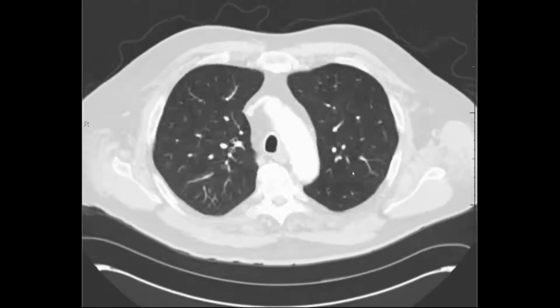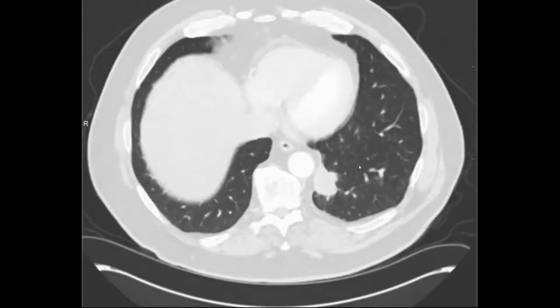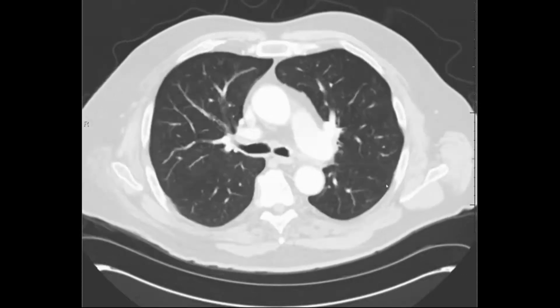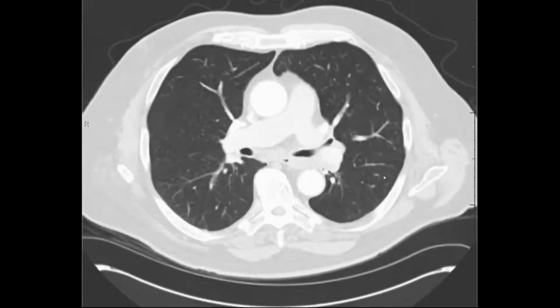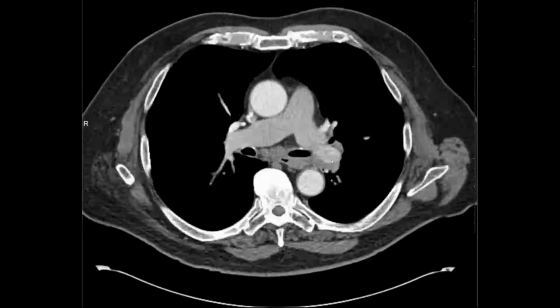And now I would want to evaluate, just because of the size of this thing, I'd be a little bit suspicious for other malignancies within the lung. And as I look here, I see this tiny little 3 millimeter nodule in the left upper lobe that I would certainly report. And they did report it in their evaluation of it, the chest folk here at the University of Colorado.